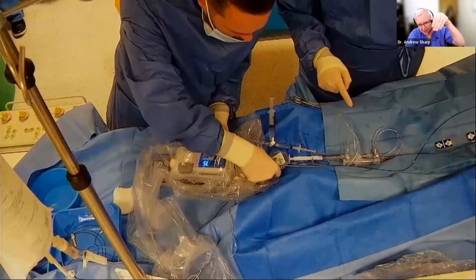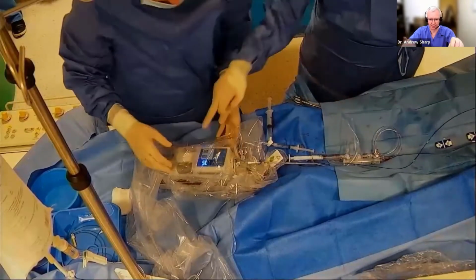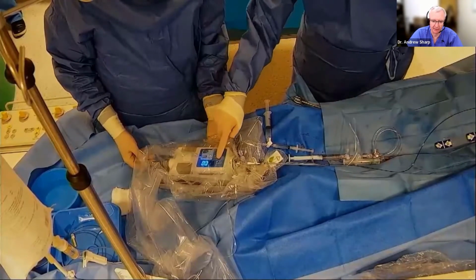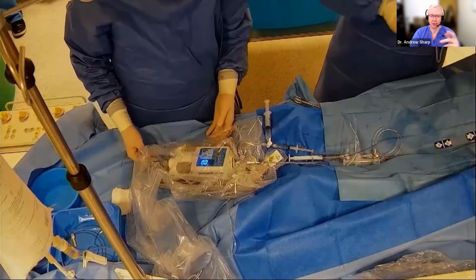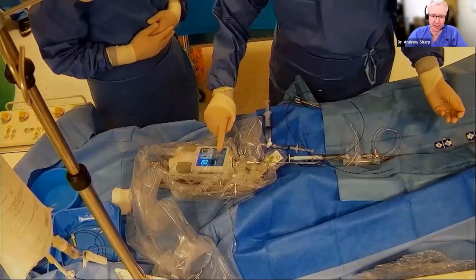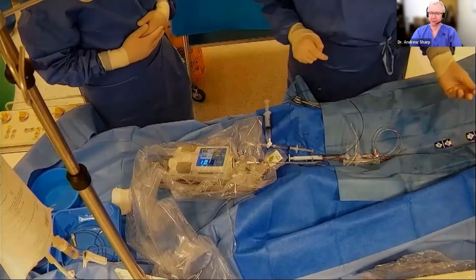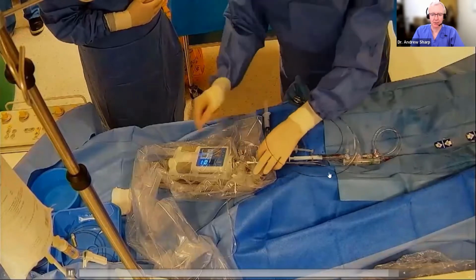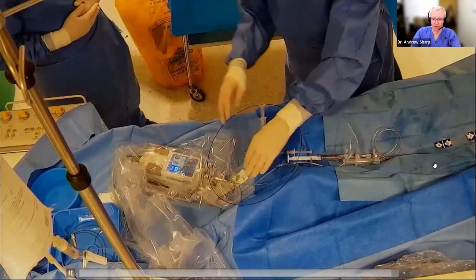You then slide the sheath within which the IVUS sits down into the cradle, and you reset the length, and then you press image on and make sure that you're seeing something that looks like an IVUS image. Of course, you're outside of the body, so it won't look like a coronary artery. And after that, you just put it over the wire, put it into the coronary, and press pull back. So it's a pretty simple procedure to prep.